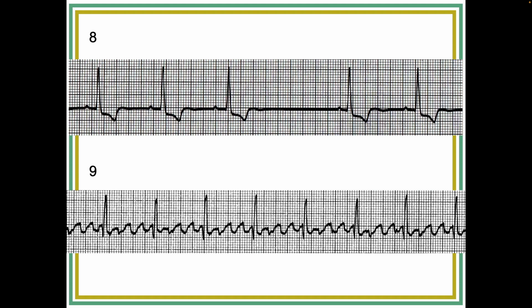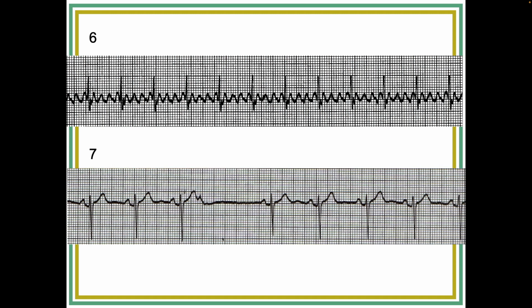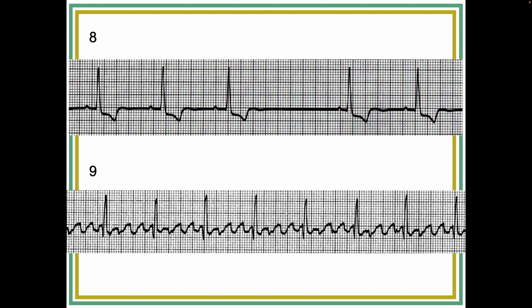Yeah, or sinus block, it is. Okay, how do we know? It sure looks similar in a way to the sinus rhythm with a non-conducted PAC. How do we know? Are you sure this is not like a non-conducted PAC that's causing that pause? How do you know? I'm sure. Okay, somebody help them out. Why is this a sinus block or sinus pause and not a non-conducted PAC? P wave. Yeah, there's no P wave.